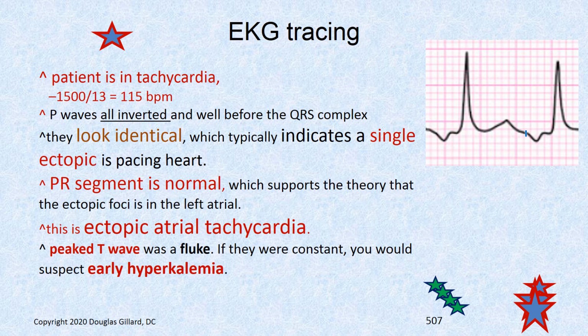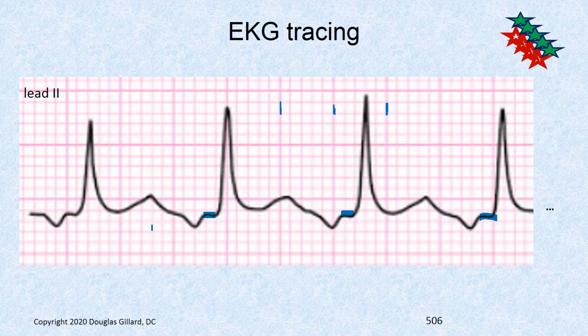Yep, that's kind of a fluke, that T wave. We've talked about that because the other ones are fine. Well, maybe they're not fine. That's peaked. Yeah, maybe I'll take that back. I'd have to see the whole tracing, but it makes you think maybe a little hyperkalemia going on there. Certainly at this age, you wouldn't expect a myocardial infarction.